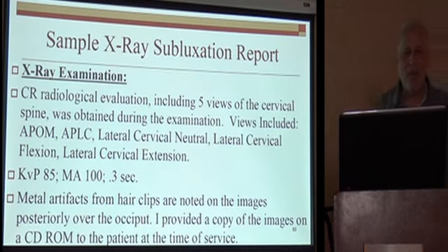So what I did here is I put one of my reports, chopped it up and stuck it in here. So you can sort of see the wording that I used. But then we're going to actually look at some x-rays, and I'm going to ask you to just figure out what kind of alignment. We're only going to talk alignment issues that you might see on these films.